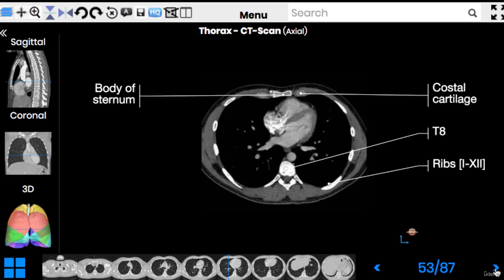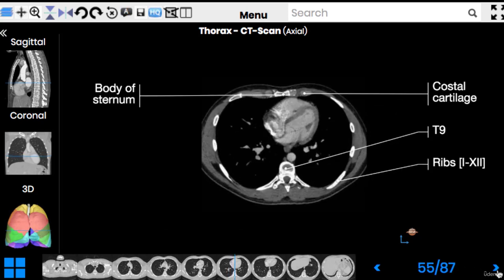You can see the thickness of the wall of the left ventricle and compare it with the thickness of the wall of the right ventricle. You see they are different. This grayish shadow in the middle is the interventricular septum, and between the atria and ventricles we have the atrioventricular apertures with some shadows of the valves in them.